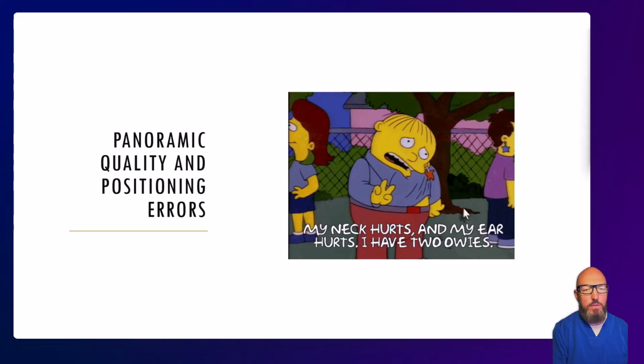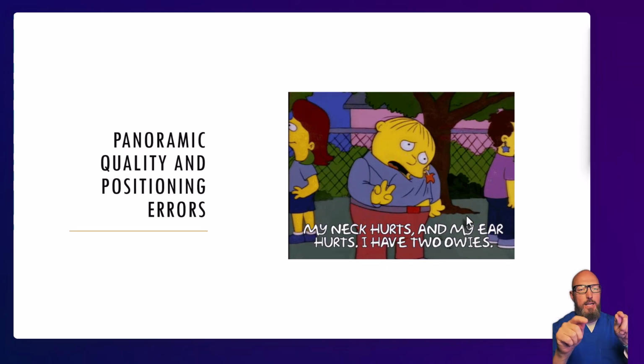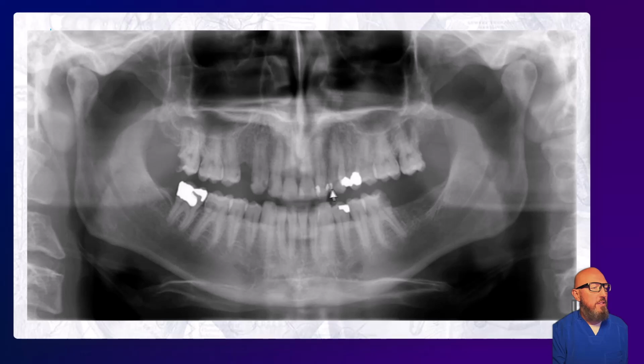So my little rule of thumb is make your patients happy, because when you do that, they have a kind of a gentle smile line. But don't make them too happy. Don't give them like a Joker smile line. We'll show you some examples here. See, this one is just on the verge of too happy, but I'd rather see this nice smile line than have it with the chin up. See how now the hard palate line gets kind of projected superiorly to the apices of the maxillary teeth? And so that's okay. It's better than the alternative.